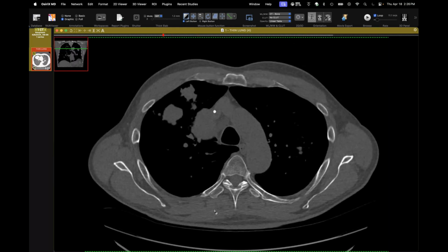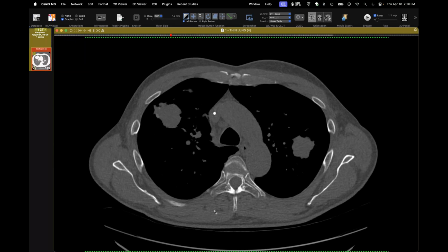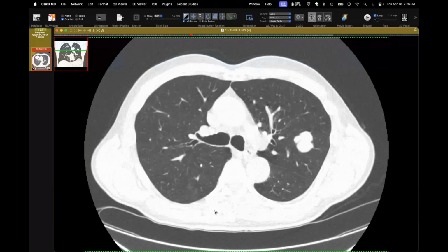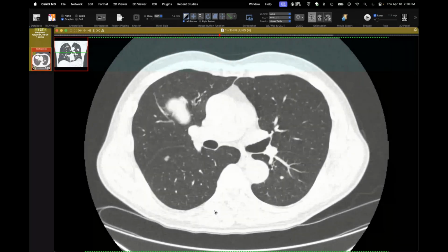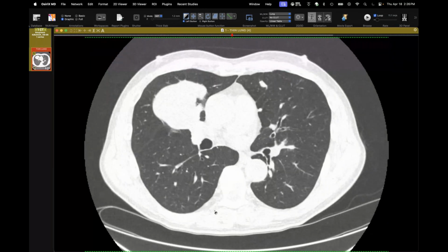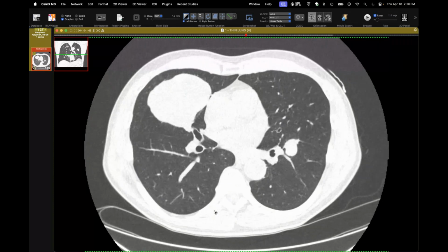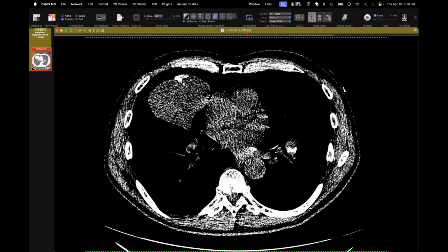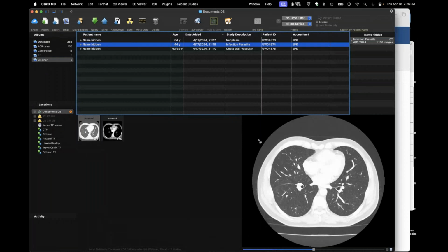All right. Well, anyway, this is metastatic osteosarcoma with actual bone matrix forming in some of the metastases. Usually they de-differentiate and we don't see much. I've only seen a handful of cases over the years, one to the pleura that left this calcific rind. But these are obviously very big metastases. I just want to show those because the matrix in there is very helpful in this case if you didn't know the history. This is probably the most interesting case I'll show today.